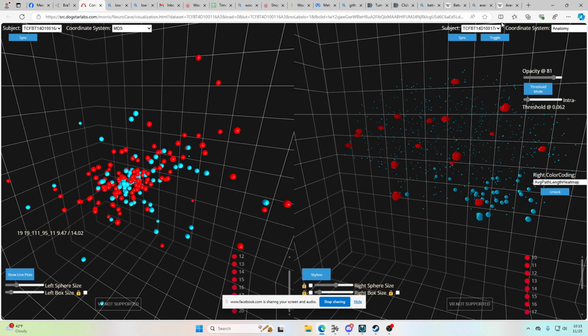So what do you say? It's voxel. What's a voxel? Well, it's the same as a pixel, but in 3D. A pixel is a 2D coordinate of a 2D screen, whereas a voxel is a 3D coordinate in a 3D MRI volume.